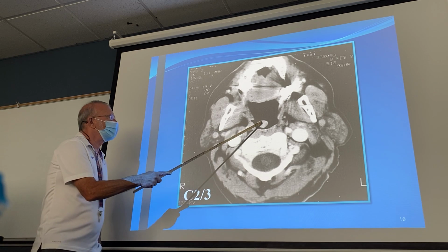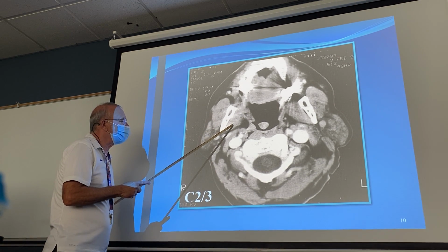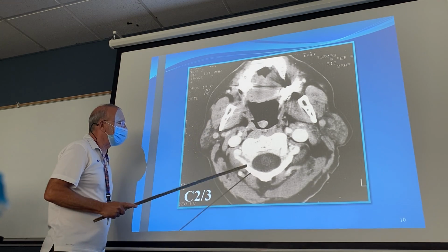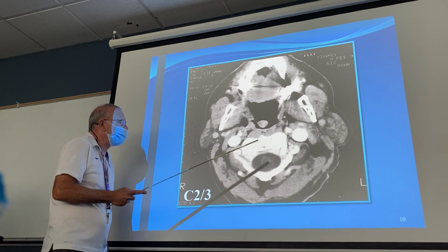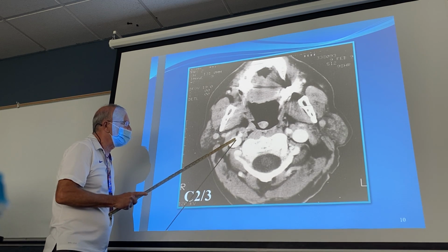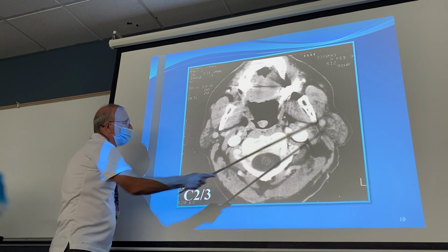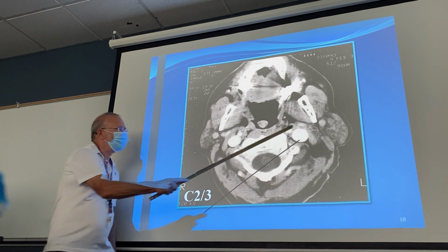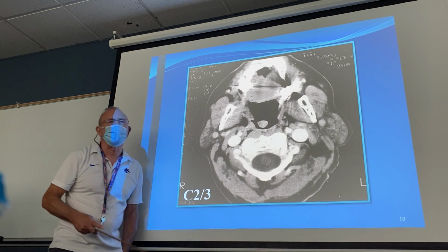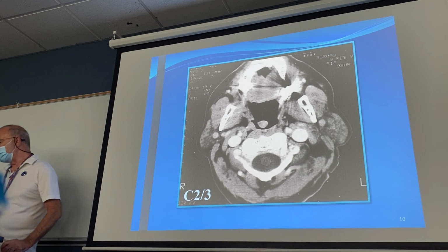All right. Uvula, once again, it's getting redundant. Okay, medial pterygoid muscle, lateral pterygoid muscle, SCM bilateral. Okay, again, nothing really different. The internal jugular, internal carotid, traps back over here, parotid. Better definition of the retromandibular vein bilaterally seen here and here. It's always going to hug the medial aspect of the parotid.